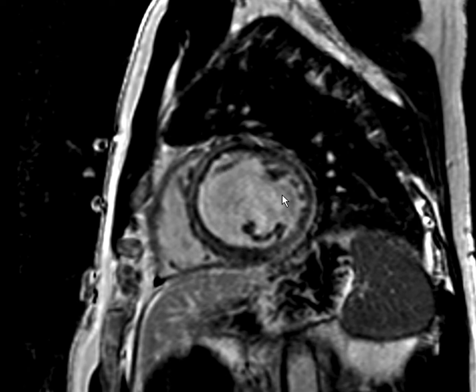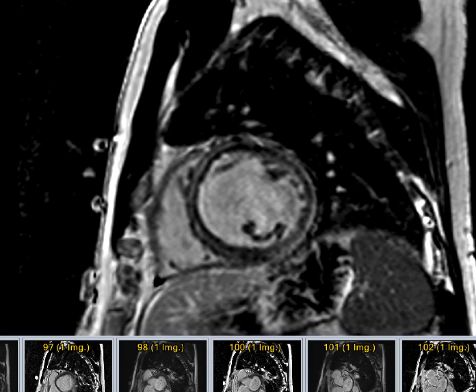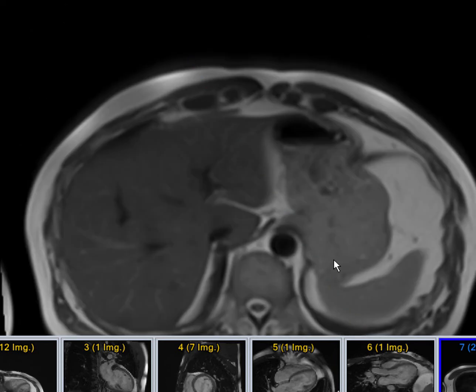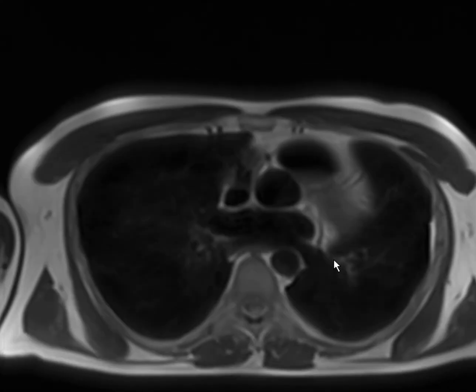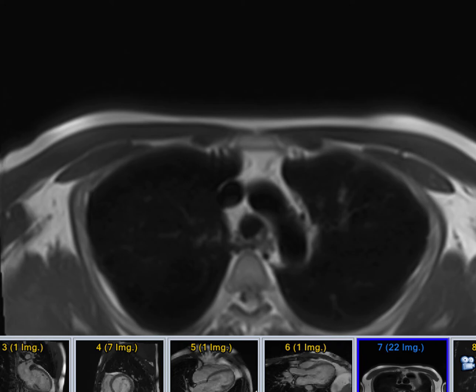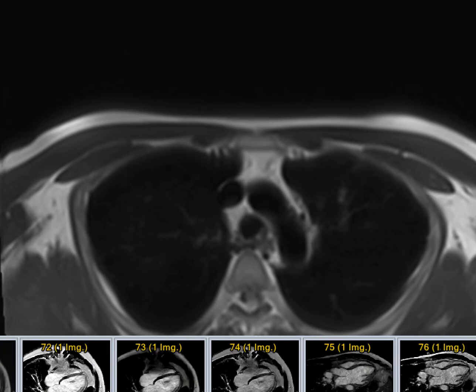The differential diagnosis in this case, first, maybe myocarditis, which was severe myocarditis. Second, sarcoidosis, but let me show you the axial images. There were no lymph nodes, and there was no indication of sarcoid, although in 5 to 10% of cases sarcoid could be affecting the heart only without affecting the lungs. Back again to the late enhancement.